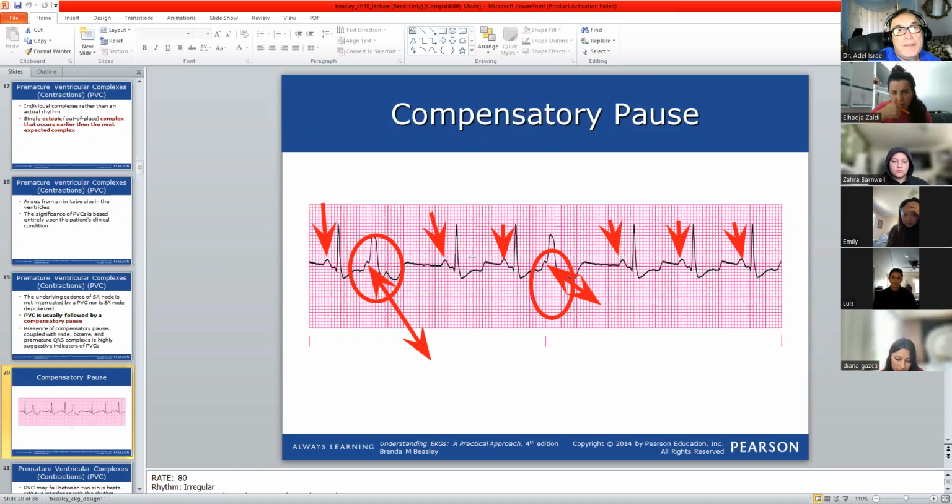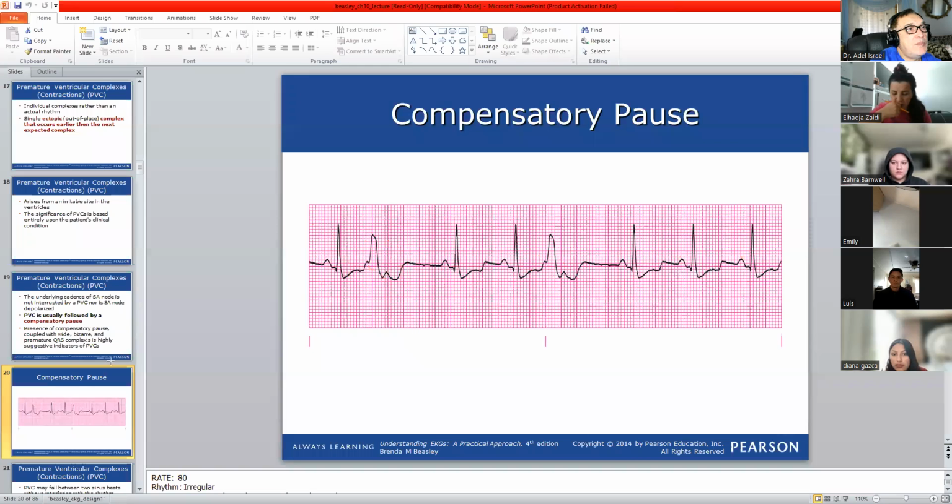Can you compare, Lewis? The tip here is not like this one. So this is the description we use for the ventricular. This is very important and very easy for us to understand. Any question before we leave this slide?